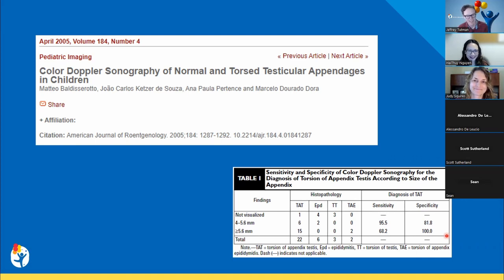Had I known about the size criteria, I would have used it, but maybe that's too honest. I agree. When they're normal and they just happen to have a hydrocele and it's floating in the water, then it doesn't really scream inflammatory, and there are no inflammatory changes. To me, that looks like a normal appendage. In all the cases like you present, that's usually how I see them, with lots of inflammatory changes. Then you see something that is a little too large and avascular, and I would definitely suggest that.